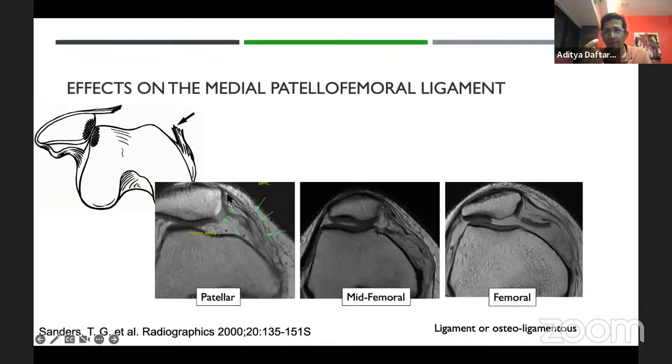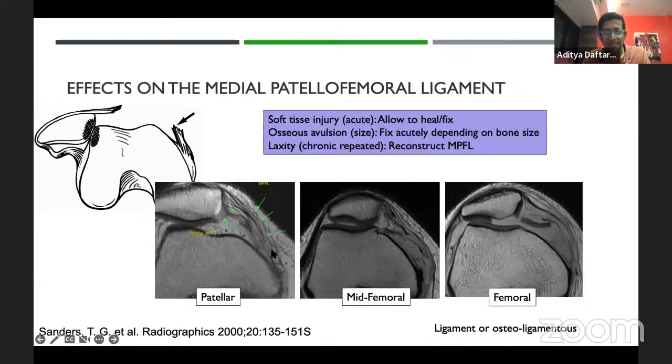It's not like one thick structure. You can see sometimes it's a little thin band like this. So this is the patellar attachment, and the femoral attachment is rather heterogeneous. It is irregular. It is thin. It's not a single band of tissue, but overall it's a band of tissue. So I hope that clarifies that this is the patellar attachment. This side here would be the femoral attachment, but they are quite just blending into the adjacent tissues.